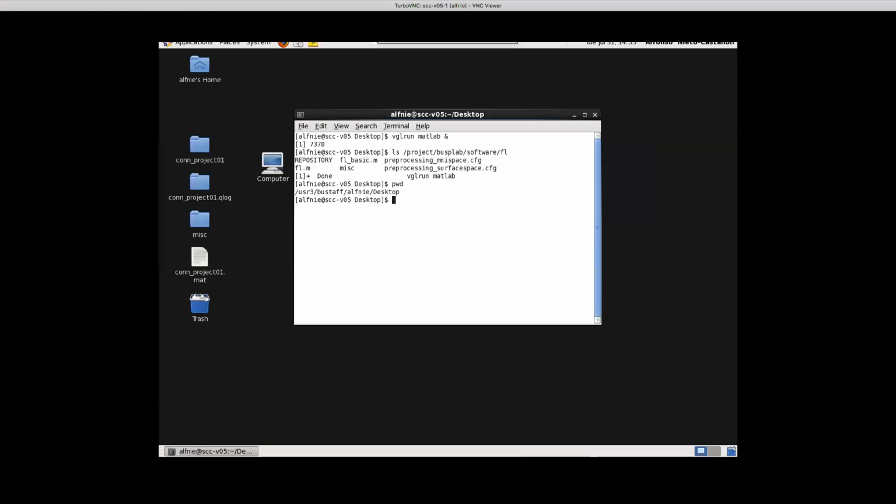That is like a convoluted representation of how the brain looks for that very specific individual subject. That is totally different from the surface of a different subject, and that is totally different from a third subject, and that is totally different from the actual FS average space. This is the surface level data. Then we take that surface that looks like the subject's brain, and we inflate that.